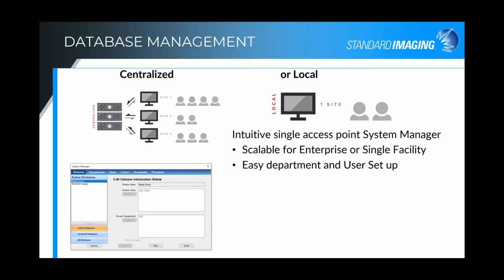Users, we've got a number of different types of users they can set up as far as security and availability of the software. So we have a higher end one, what we call a super user, and that has access to be able to add and delete functions within the system manager. You can change your thresholds, add or take away LINAC specifics, things like that. And then we also have more basic ones that just allow for the tests to be done, but they cannot change any of the data or manipulate the system manager, things like that.